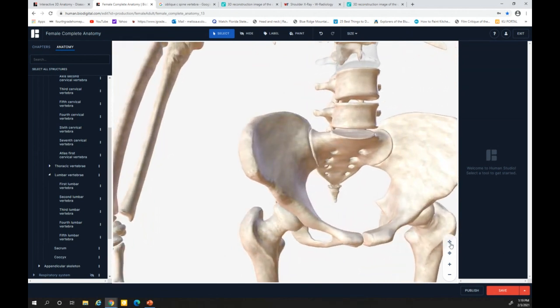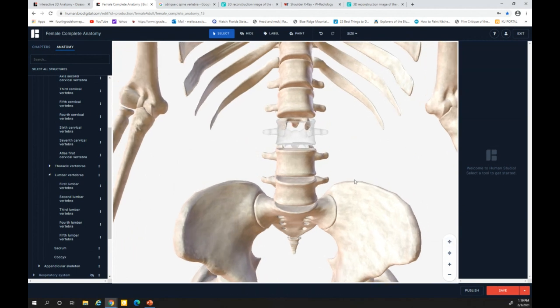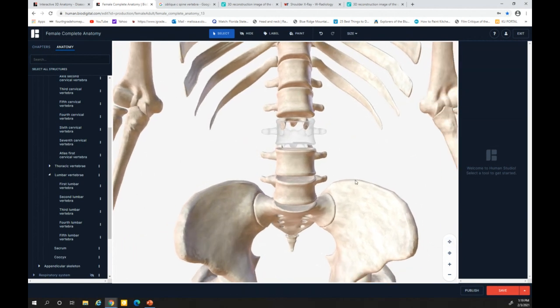So now I'm all out of whack. Let me get it back. All right. Okay, so now let's get him back right. Okay, all right, so now let's go LPO. Here we go.